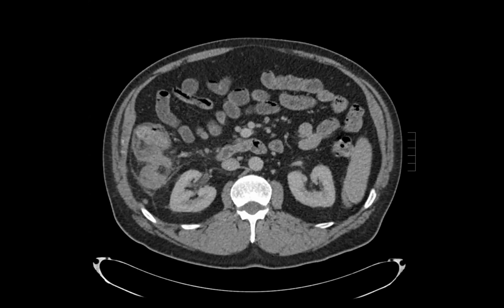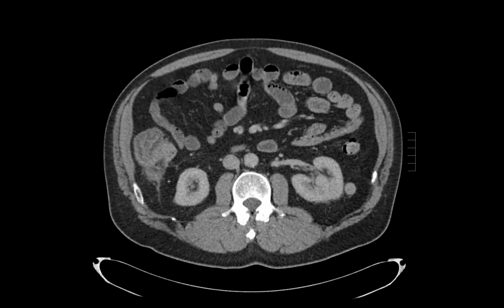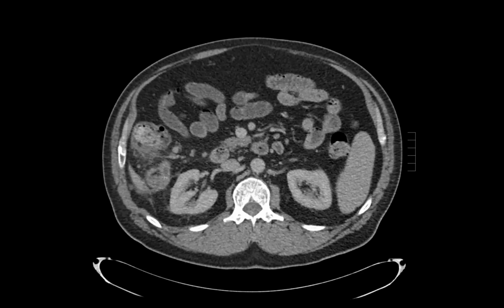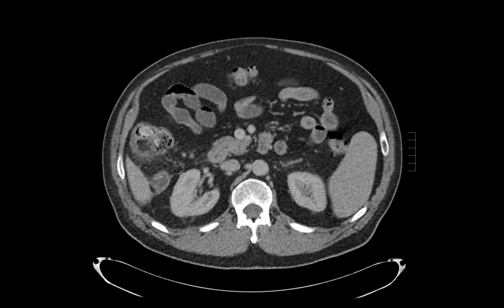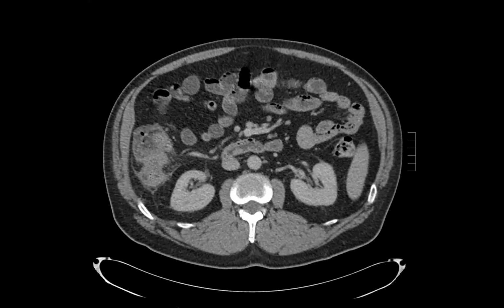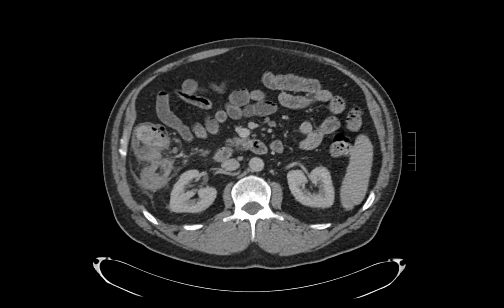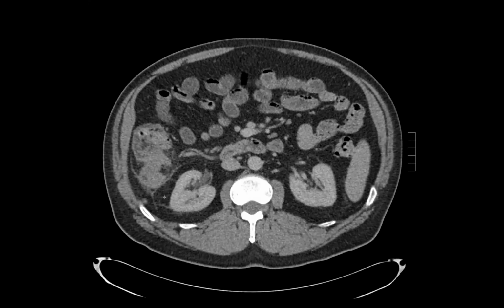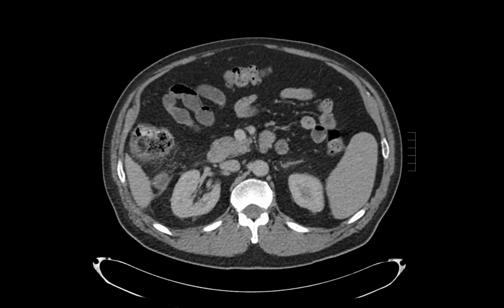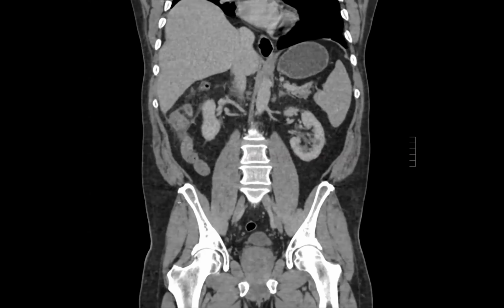But I think it's important for us to see this, right? So that things that can fool us, right? Because the appendix is obviously abnormal, but that thickening of the appendix going along is a little weird. What do other people think? Soft tissue-y. And next time you see this, are you going to bring up malignancy? And the base is distended with soft tissue stuff, rather than just, that could easily be ruptured, like just phlegmon rupture. That's fair.